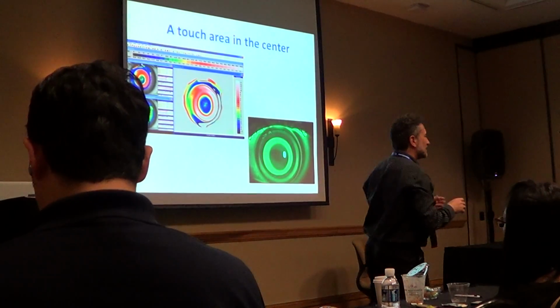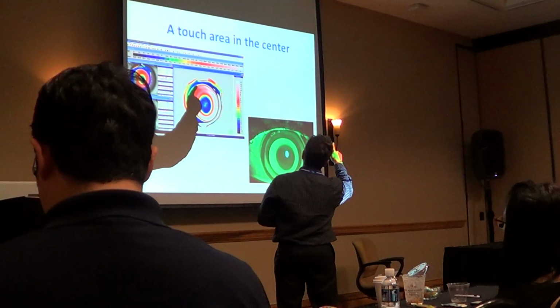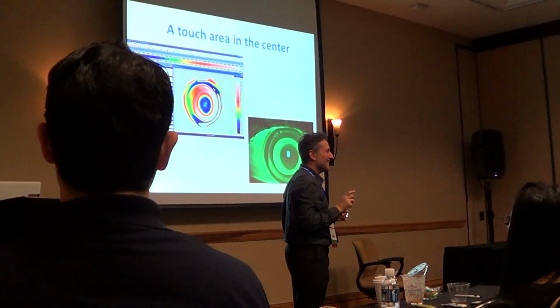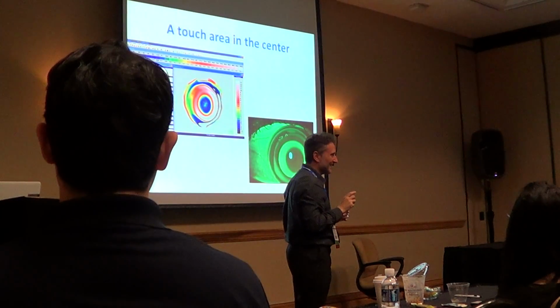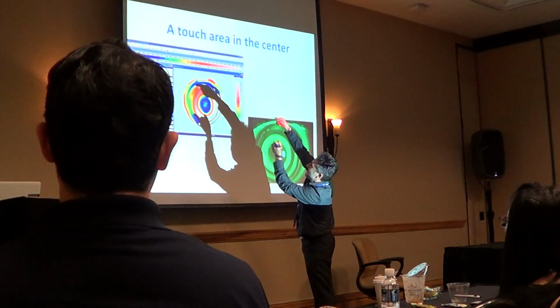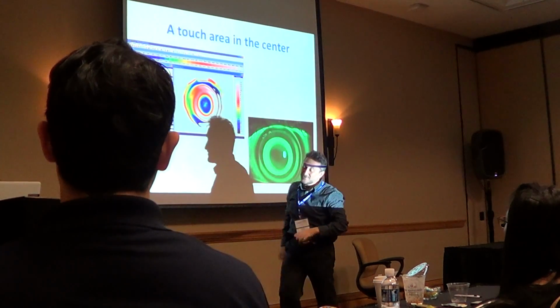The croissant is when the red ring is... You know croissant? What is it? A crescent. A crescent. Yeah. So you have one here, and you have the croissant like this.